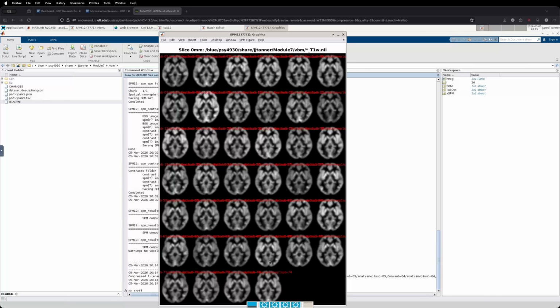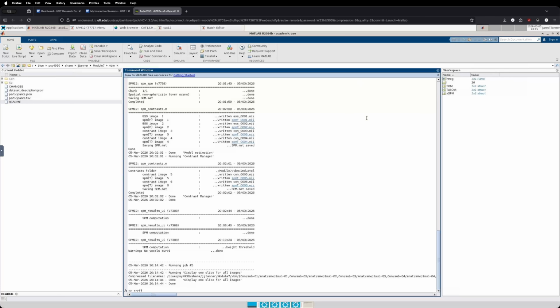They look blurry because they're smooth, and that will just make them a little fuzzier, so that when we overlay all of them, we are going to be more confident that we're looking at about the same spot in the brain and not catching some of these fine individual variability in the structure of the brain. So that's what we are now ready to use to put in our statistical models.